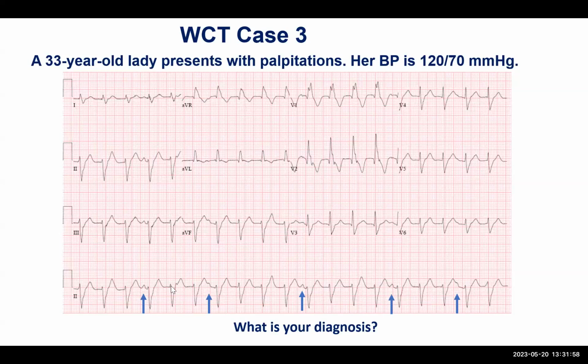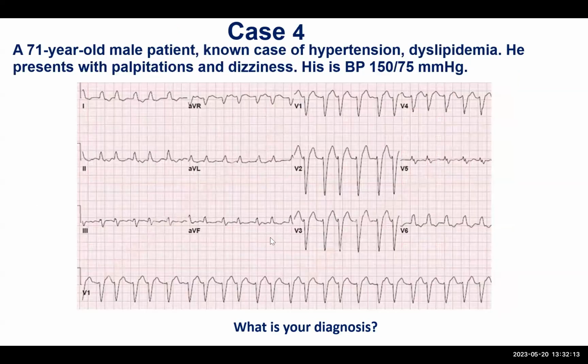What do you think the origin of this ventricular tachycardia in a young female who is... Excellent, fascicular VTAC, excellent. We'll discuss actually the VTAC. The wide QRS complex is just a brief introduction on how to differentiate, but the main talk will be about the VTAC itself. We will discuss it in the second talk.